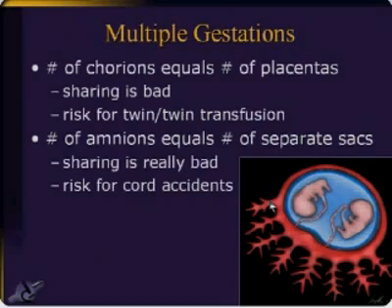What if you have to share not only a kitchen, you're monochorionic, but you also have to share the bedroom. You're monoamniotic. And now you're really going to get into trouble because these guys can get all twisted up, and they do, and those are cord accidents. All right? So now let's look at these by ultrasound.